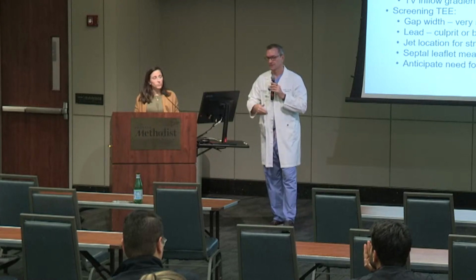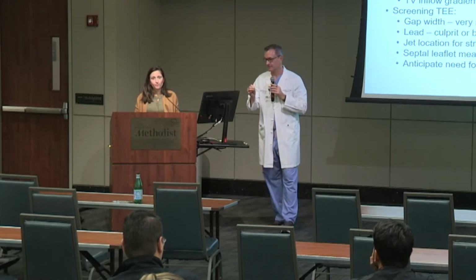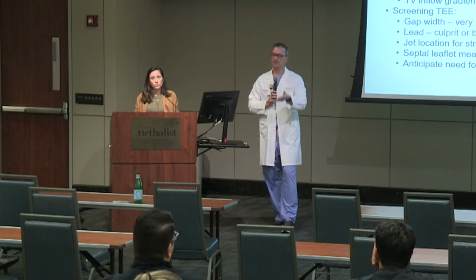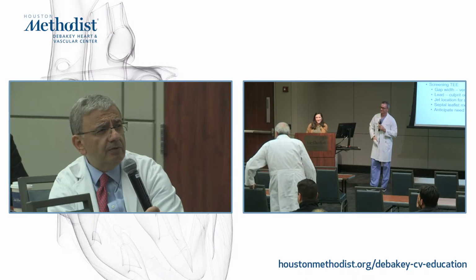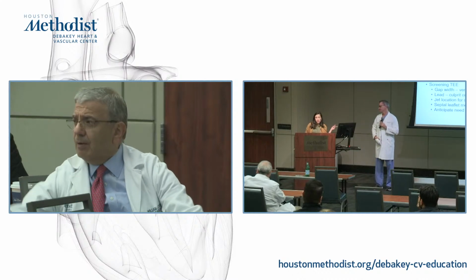But individual to the patient, you have to see how much diastolic area you have, how tight you want to make the valve. That's part of the pre-planning huddle. We do some baseline images, we talk to interventionalists, and we're thinking this clip for this reason. And they always say, yes, of course. Do you measure the length of the posterior leaflet? We do. Yes. Every time. As we measure the septal on the tricuspid, we measure the posterior for the mitral, and it has to be where you're planning to grasp.